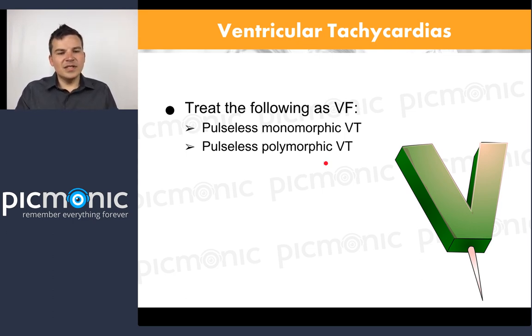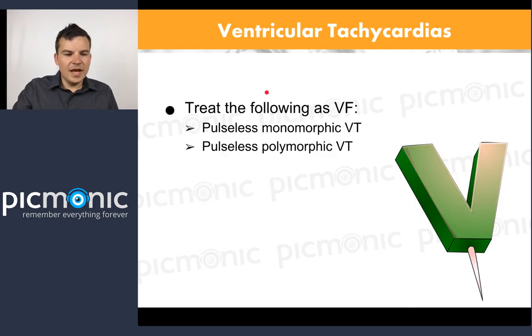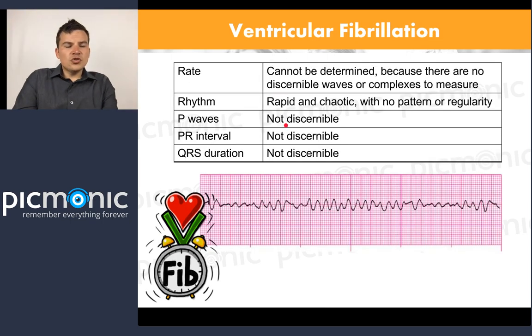Now, I already kind of talked about this slide, so I'm going to skip. Oh, maybe I didn't. Yeah, I did. Sorry. Now, the next one I want to talk about is ventricular fibrillation. This is something I just want you to really not just guess every time you see a squiggly line, you just guess VFib. Please don't do that because it's pretty easy to be able to tell.